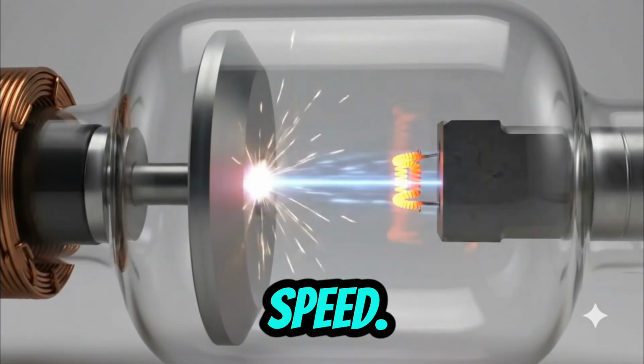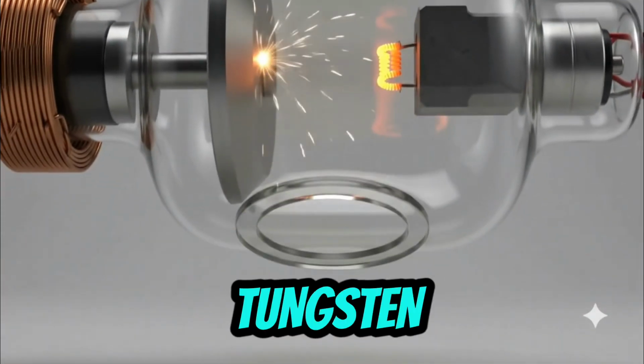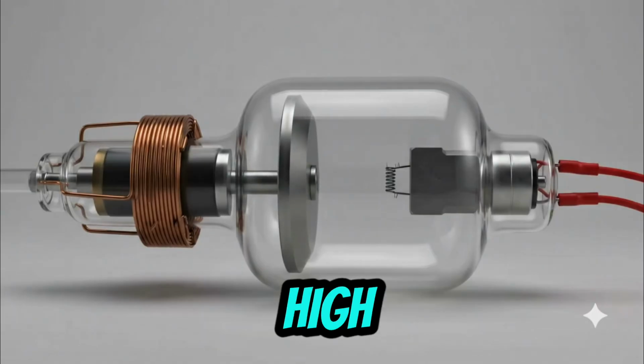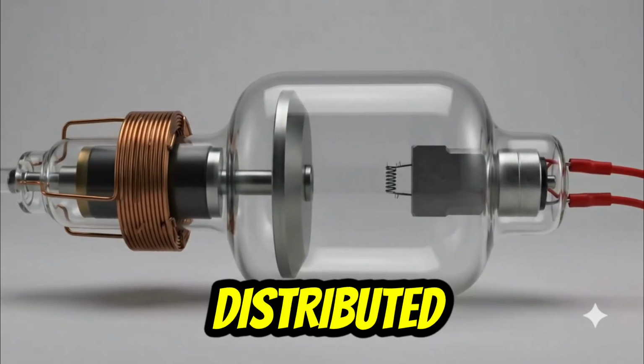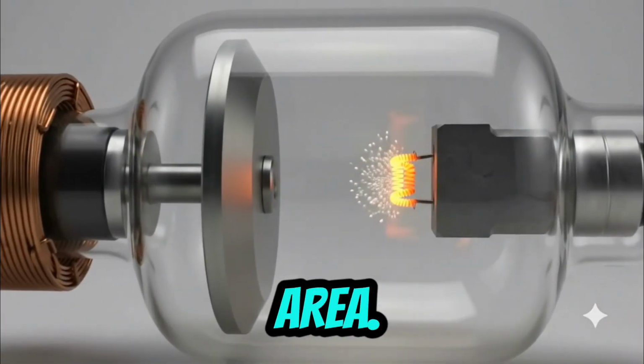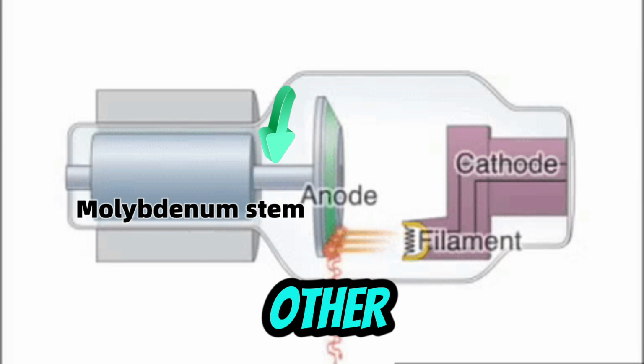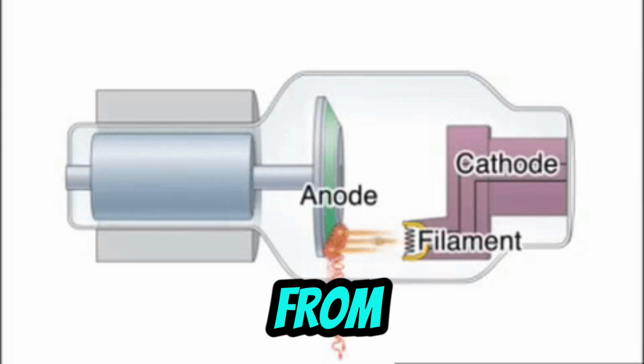A high voltage is applied between the cathode and anode, accelerating these electrons toward the anode at very high speed. The anode consists of a tungsten target supported by a molybdenum stem. The anode rotates at high speed, allowing heat to be distributed over a larger surface area. The molybdenum stem helps reduce heat transfer from the anode to other tube components, protecting them from excessive heat.